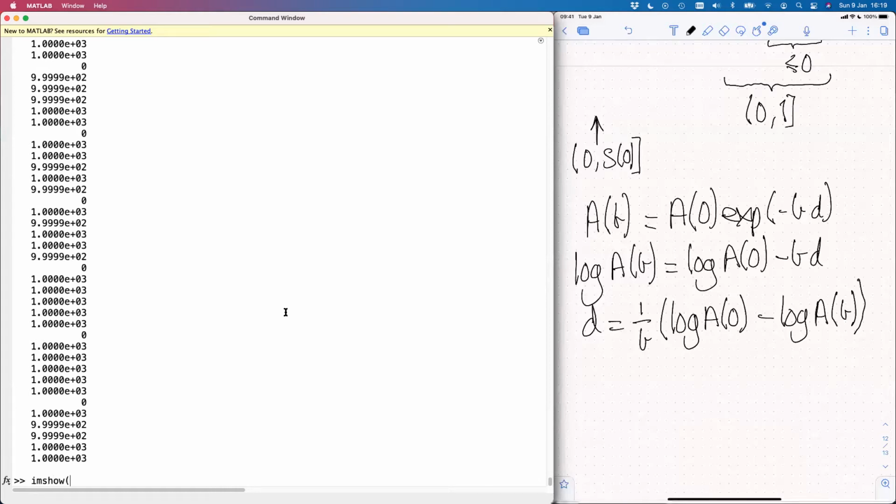So let me start just by showing you one slice of the first image in that array. I'm going to manipulate it just to get it in the right orientation. Flip up down is doing a vertical flip of the image. And I also need to squeeze just to avoid singleton dimensions in the array. So I'm going to take the first image in this DWIS dataset, every pixel in a particular slice.